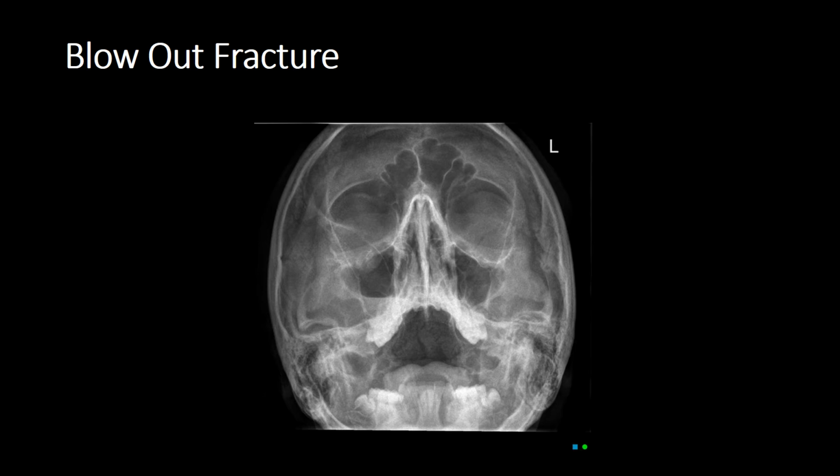You may occasionally get a tiny fracture fragment within the maxillary antra, which is a detached fragment from the orbital floor. If you're going to see any part of the fracture, that would be the only bit you see. But classically, you get the soft tissue opacification or teardrop sign. And you often get an associated fluid level.